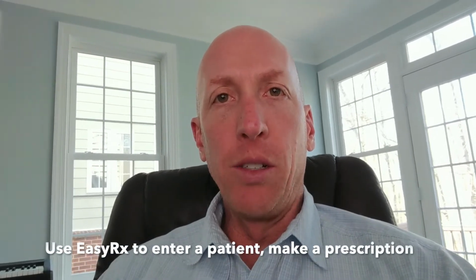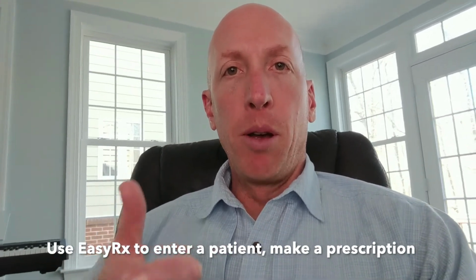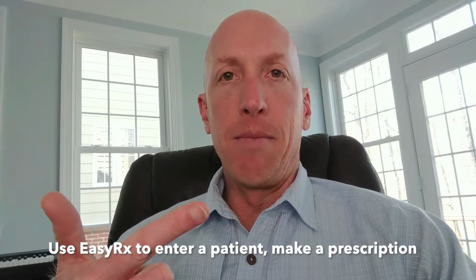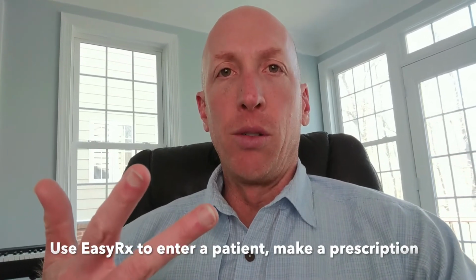I just wanted to do a quick tutorial on how I use EasyRx in my office. So this is how to put a new patient into the EasyRx system, how to link a scan, a digital tooth scan, and how to manipulate that scan and prepare it for sending it to the printer. So we'll go over all those things today.